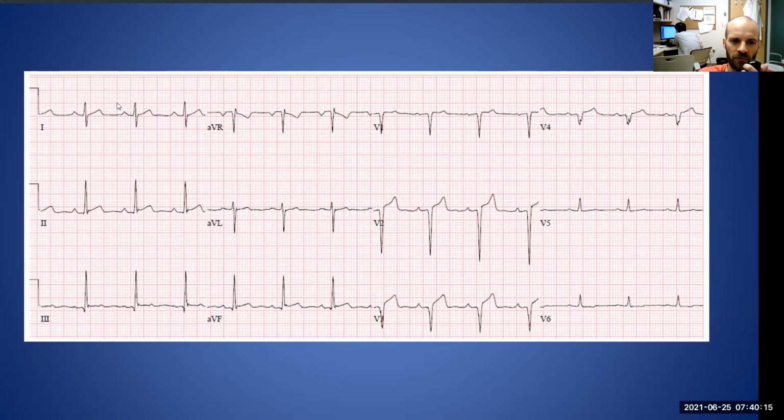Don't have any ST elevation. What about our T waves? No, our T waves are all pointing up. There may be a little bit of ST elevation here, but it doesn't look particularly pathological because it's got that concave appearance upwards, hasn't it here? It's got that scooped pattern, which is less commonly associated with MI, but it could be.